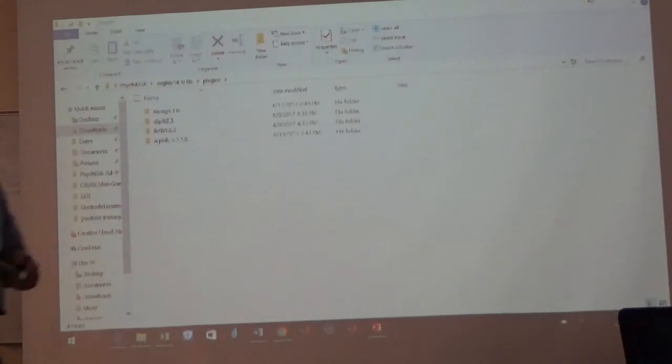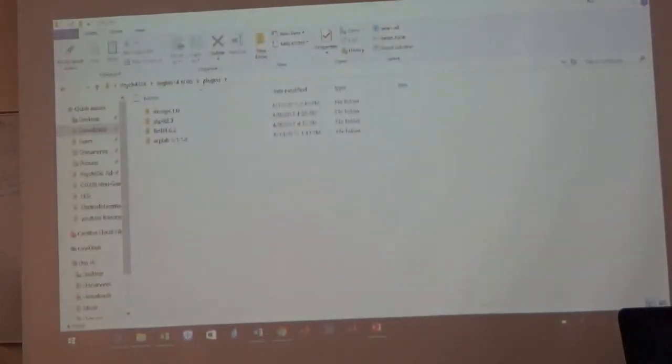Just load up ERPLab and then create. How are you guys doing? Did you already set the top? That looks pretty low. Good job. You guys said you're okay.